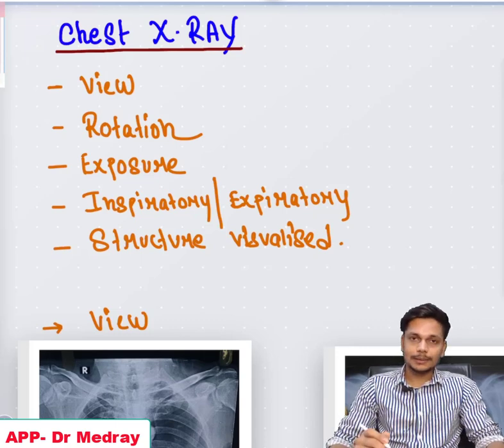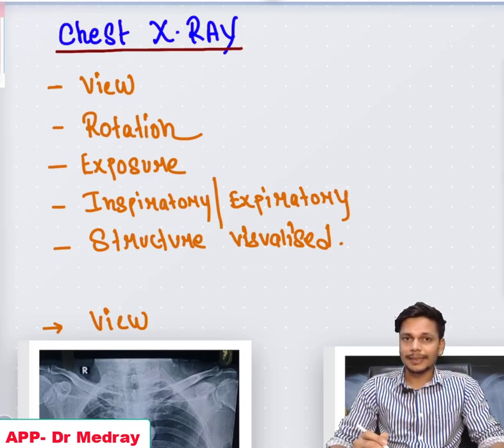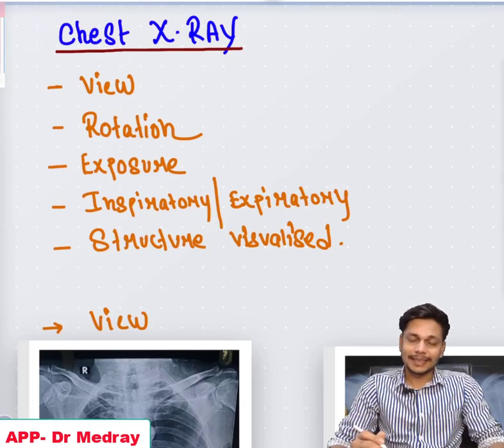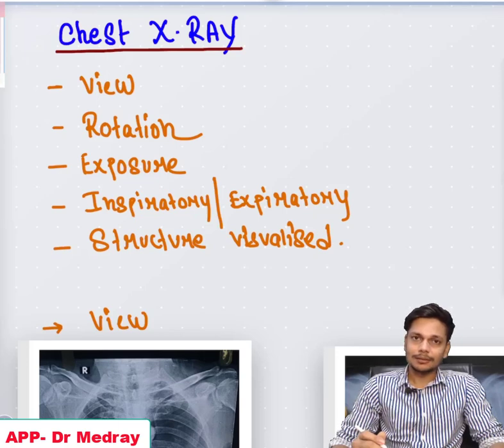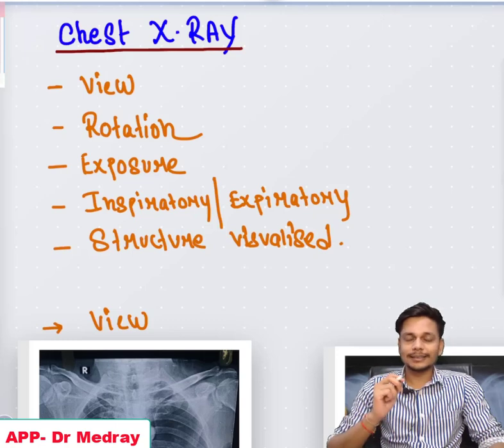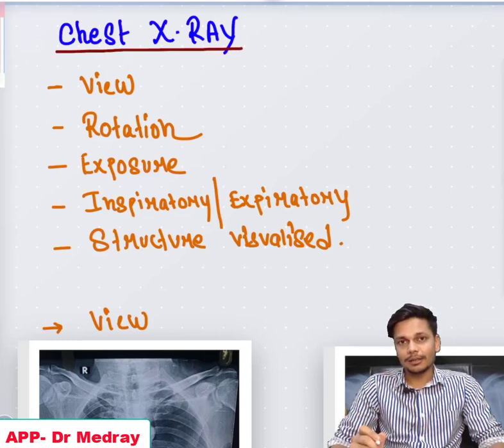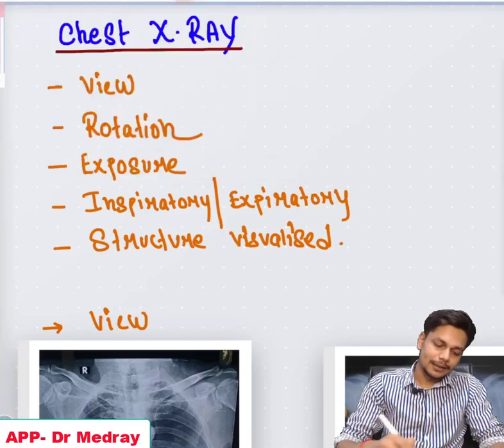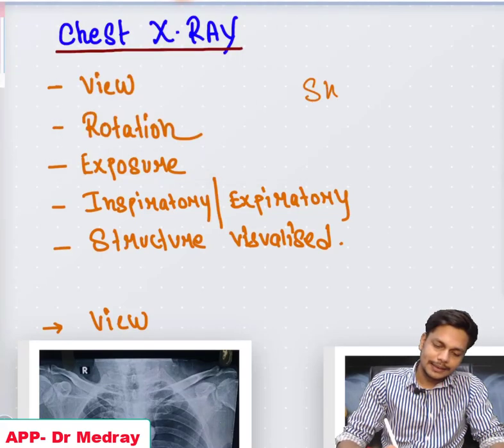So we are going to discuss the chest X-ray from the medicine practical point of view, that is the table viva, the X-ray you are asked about in your practical examination. Suppose you are provided with an X-ray in the examination and asked to interpret it, how will you start? That is the skiagram.